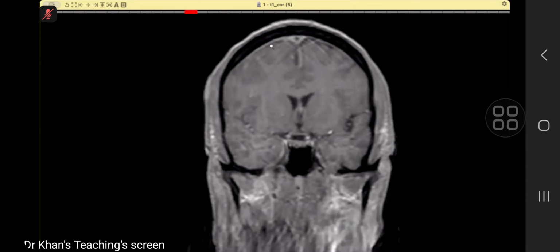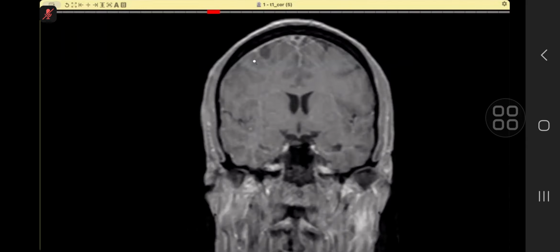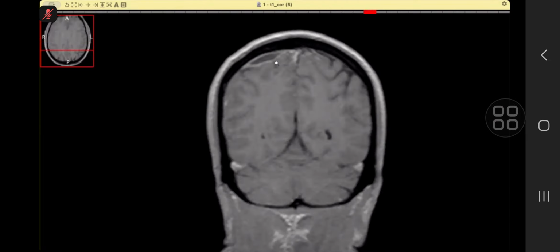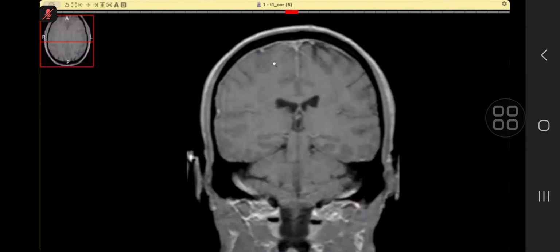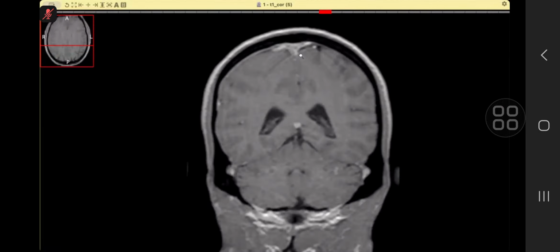Now, if you see, look at this dura, and this dura is showing enhancement. And there is some element of enhancement here. So something is happening there and something is happening here. And if we go now, here you are. Actually, you can see, I think this was picked up by the candidate. Epidural. So the word epidural or extradural was, I think, not coming to the mind. So this is going all the way posteriorly.